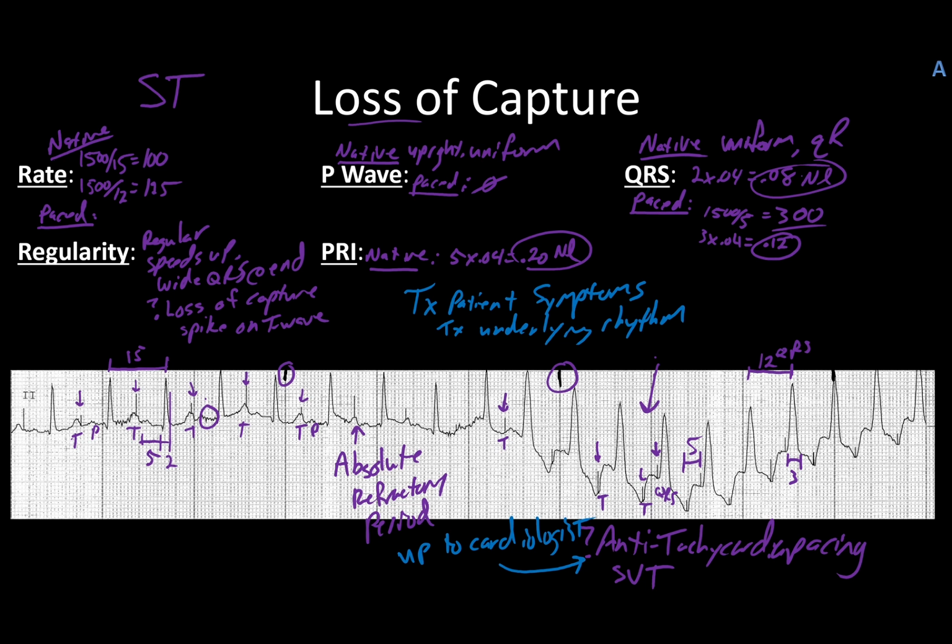So with all of this mixed mush, I'm going to say not paced at all. We're going to say sinus tach with loss of capture, wide complex tachycardia.